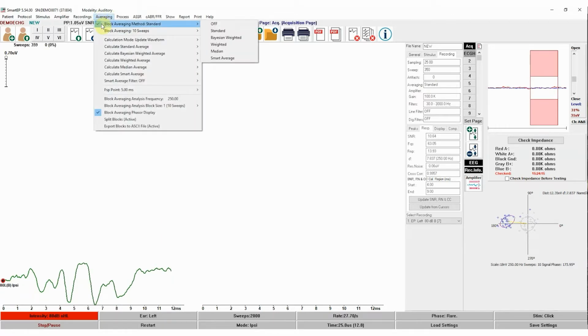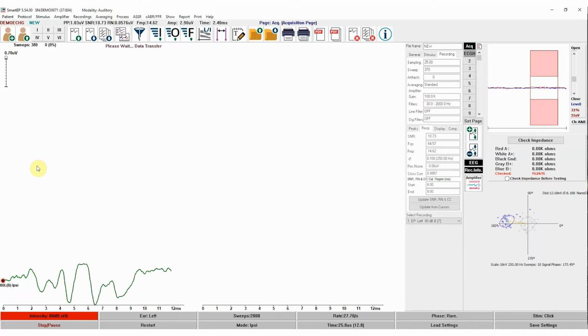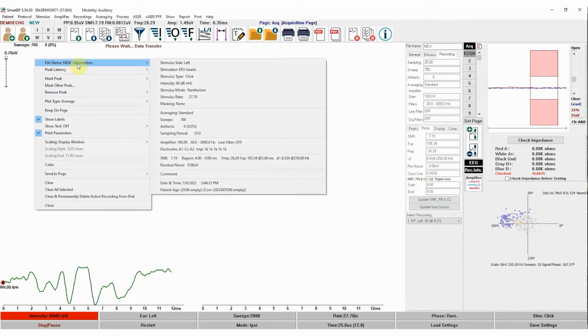During acquisition, note that there is a live update of the phasor diagram for the recording being acquired, with dynamically changing D' sensitivity measure. When the phasor diagram is displayed, the D' measure can also be seen in the Response tab of the Rec Information panel and the File Name Information submenus, along with other response quality measures such as signal-to-noise ratio, residual noise, FMP, and FSP information.